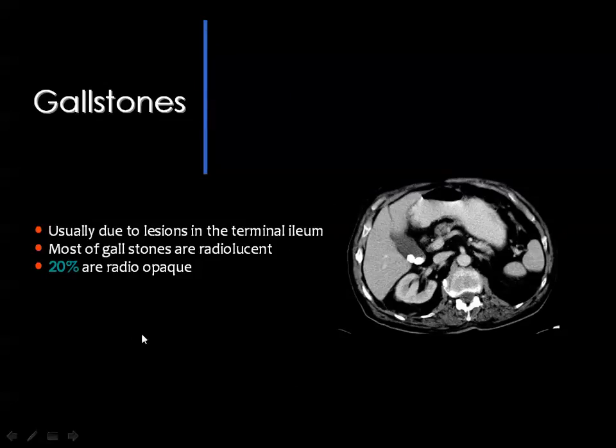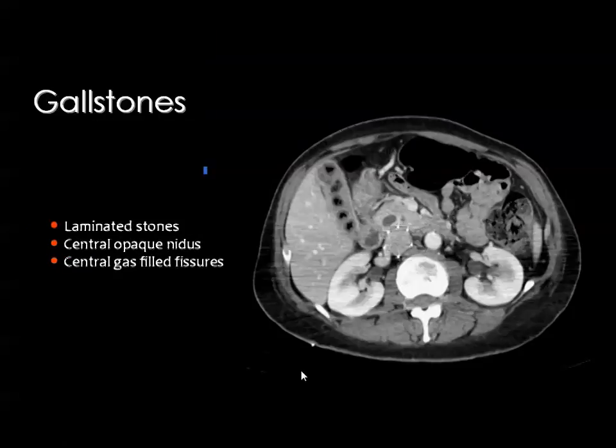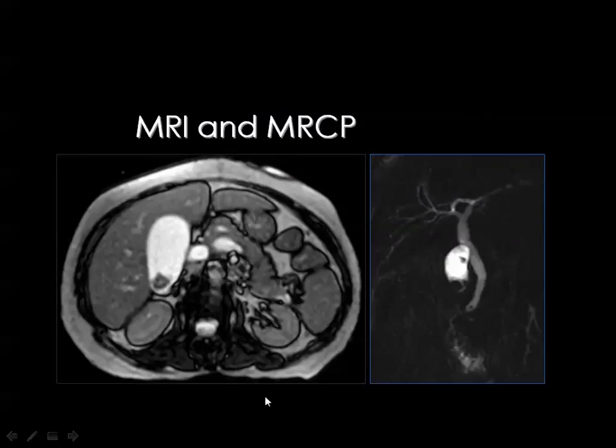And this is the appearance of the gallbladder calculi by CT. This is the gallbladder, and these are two radiopaque stones, and this is a frequent incidental finding during CT examinations performed for any other indications. And gallbladder stones also may contain gas sometimes, and you see these are multiple gallbladder calculi by CT scan, and you see extreme hypodensity within the stones representing gas.